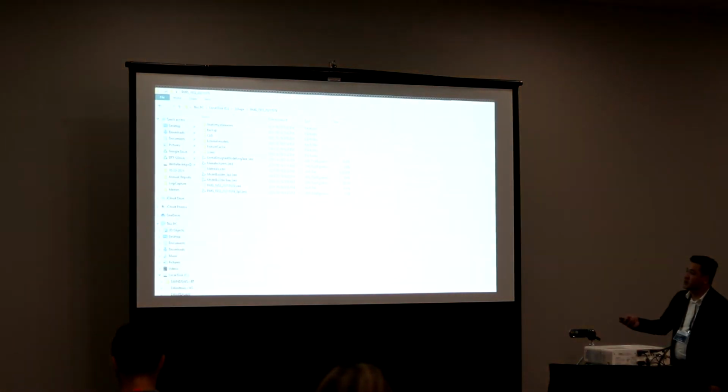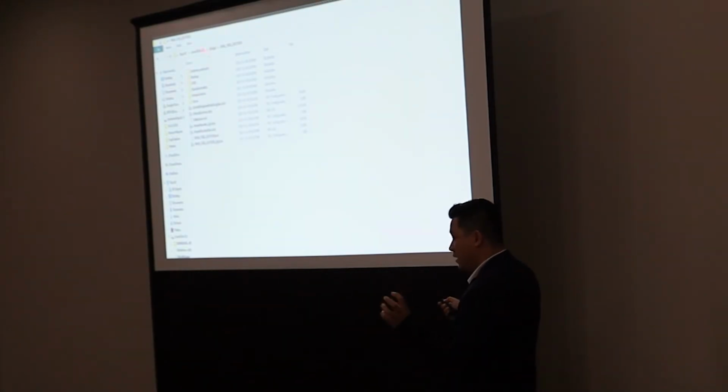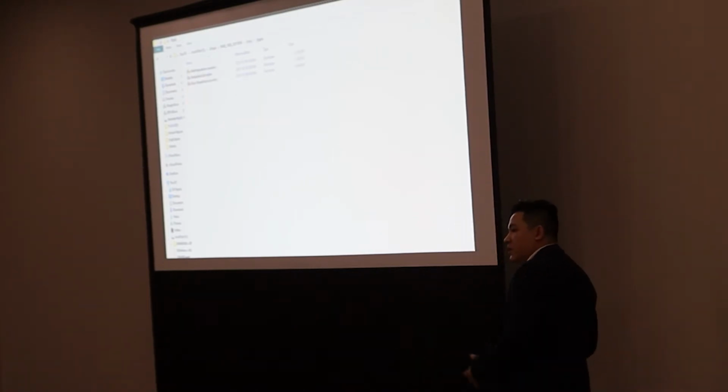And then, so of course, the next one is your scans folder. There was a couple other folders here. External models. These are the Pontic files, not in alignment. These are just the ones that you used in the library before they were modified. Feature cache is where the software, like all your mouse clicks are stored. So this allows you to redesign it really quickly if you need to. And then scans, that's another important folder where you need to kind of focus.